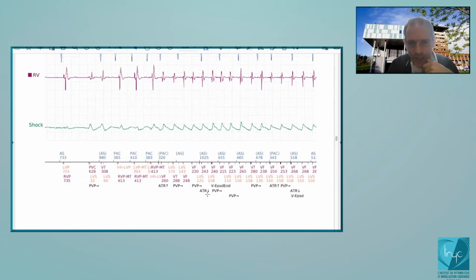So this is where you will have the end of the episode. You see now that 1, 2, 3, 4, but you don't have at this time the 8 out of 10. So it's going to be the end of the episode. And that's not something that you can reprogram also. When you analyze the counter, you need to understand the initial duration, the 8 out of 10, the 6 out of 10, the different durations that you can reprogram, but you need to understand also what it means for the device, what defines the end of the episode.